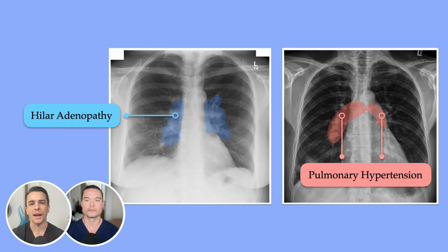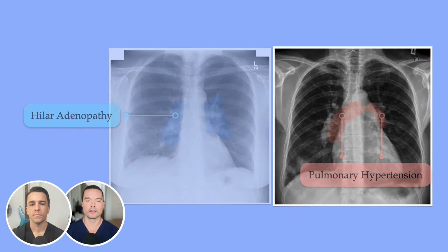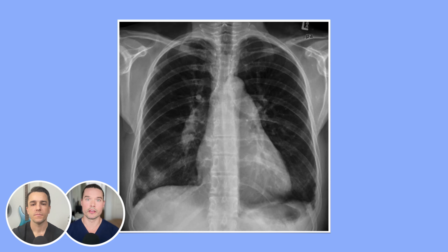But again, this is not a diagnosis you can make just with a chest x-ray. So let's highlight this a little bit further. First, we'll highlight the right ventricle for you, which, remember, sits a little bit more anterior. And that blue line there is a prominent pulmonary trunk. And then the rest of the blue is our pulmonary vasculature, which is also larger and more engorged.